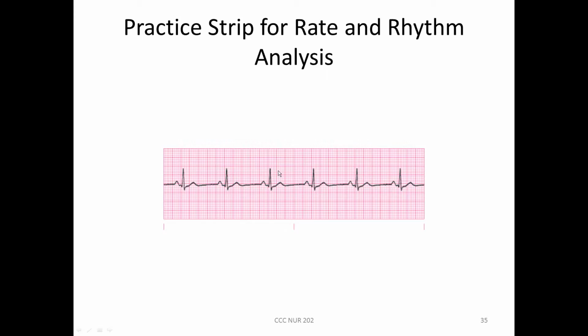So I'm going to measure this out, and you can too, with a piece of paper. You can just put a tick mark at your R's. So this is a regular rhythm.